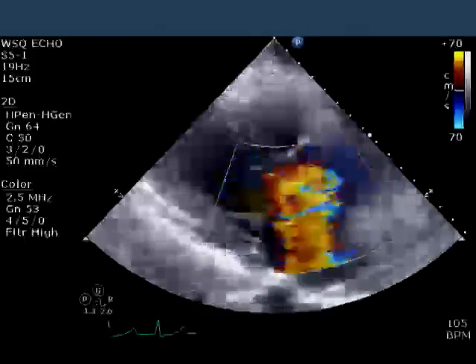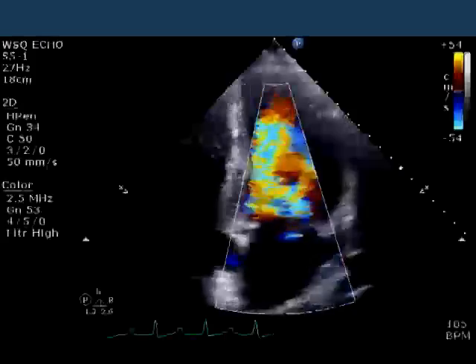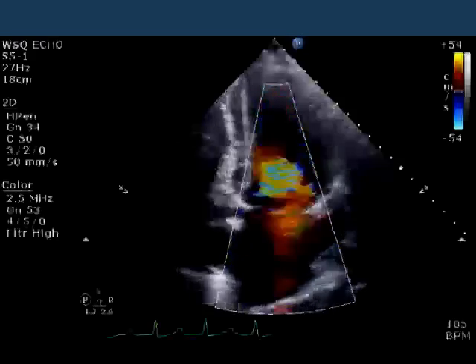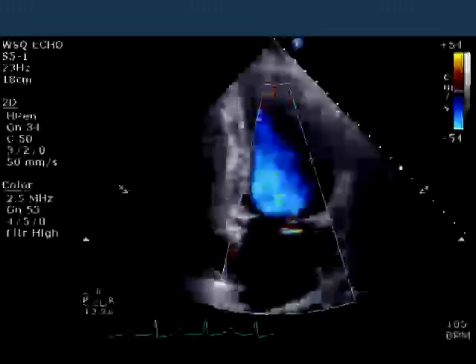Similarly, if you look at the 2-chamber view, you can see the exact same thing. There is a jet in the left atrium that you can't account for by just aortic endocarditis. There's continuous flow in there. Where is it coming from?